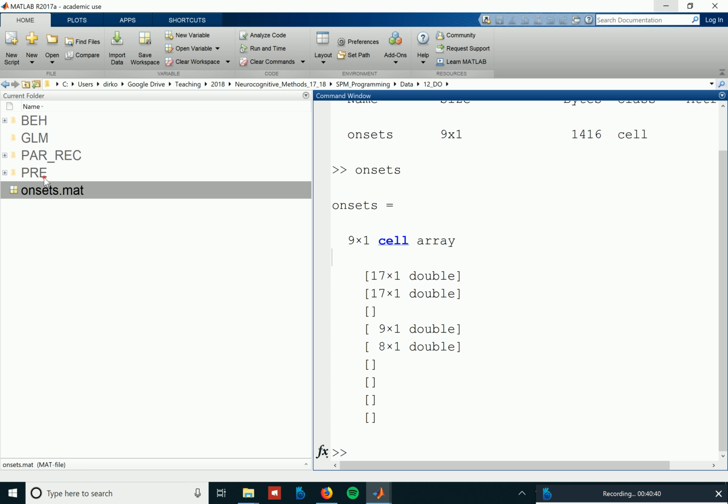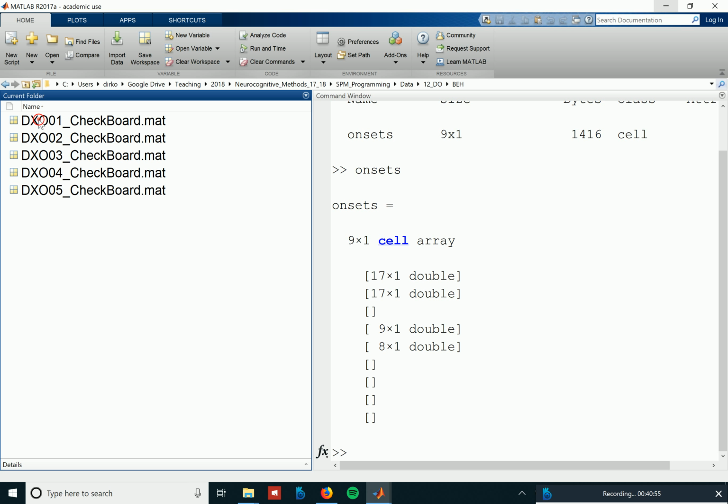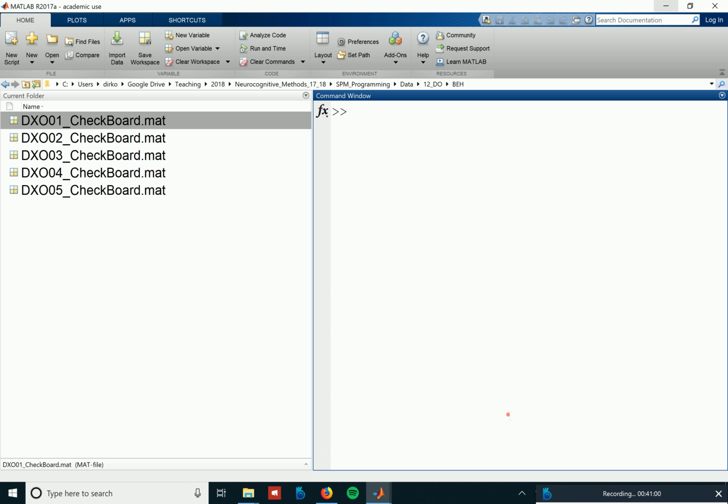So one thing that we can do is... but from which variables did you extract these onsets though? Yeah, I think I will do that for you so that you don't have to go into that. I think it was from the event log, but I think this also has some variable which name I can't remember that actually looks like this.